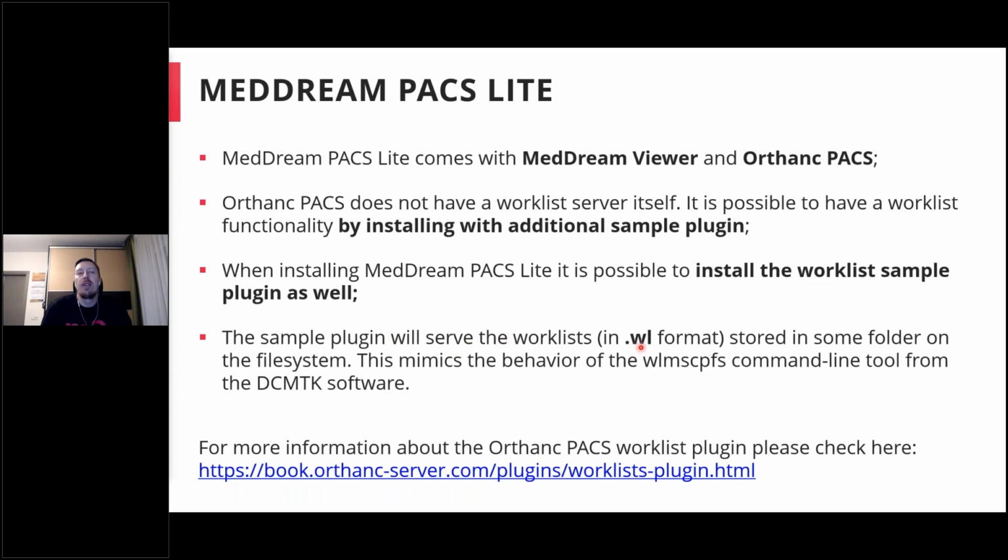They should be in DICOM format, in .WL format, and they will be stored in some folder in the file system. This sample plugin will mimic the behavior of the DCMTK toolkit, so it will behave as the worklist SCP server for the file system.